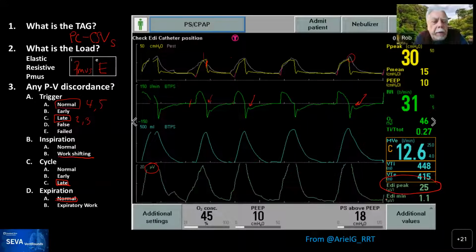Very good. Excellent. So a good amount of learning on this slide regarding triggering and cycling, and then reviewing the EDI signal that we have available. Thank you. I'm looking for any other comments. I don't see others. Okay. If you have any questions, comments, just unmute. And again, if you see something that doesn't make sense, say it, because we're all learning here.